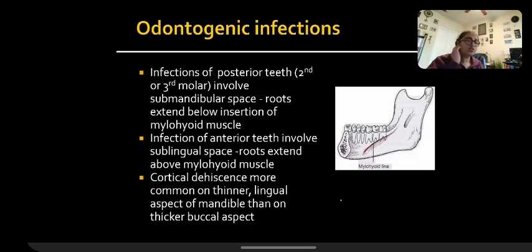Also, whenever you see these infections, you always want to look at the buccal and lingual cortices of the mandible because you want to look for any break. Cortical dehiscence is more common on the thinner lingual aspect of the mandible than on the thicker buccal aspect.